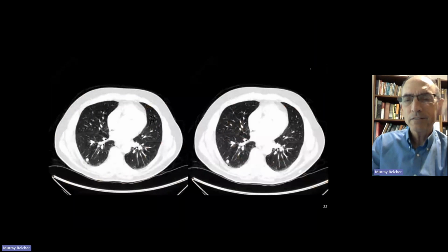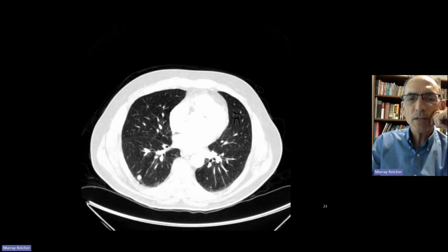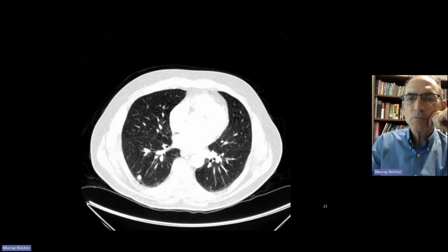Same thing here, chest X-ray, chest CT, images side by side. See a nodule here? Is it bigger? Is it smaller? Do you pull out a ruler? Do you try to subtract them? You take those same images and you report them this way. I think you can say with confidence that this lesion here hasn't changed. You'll find another lesion up here, and you may even see the gorilla waving at you in the lingula.